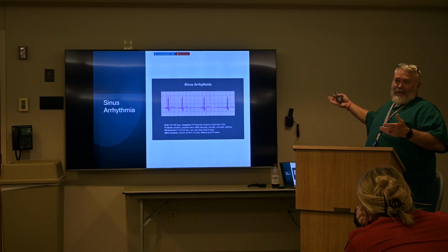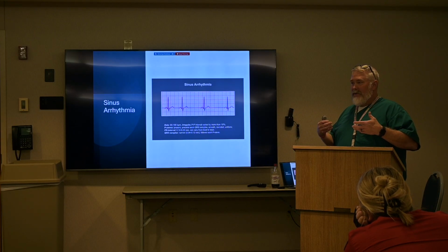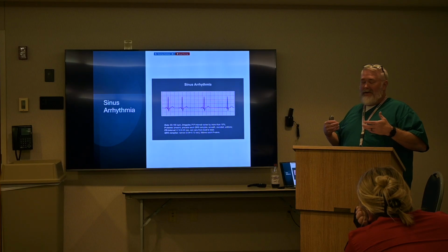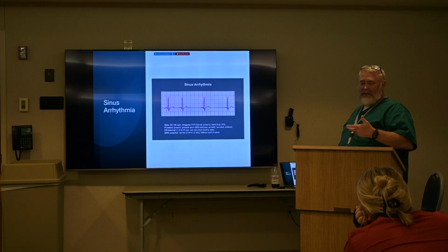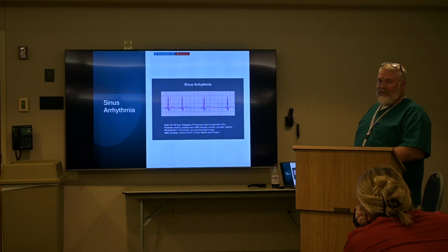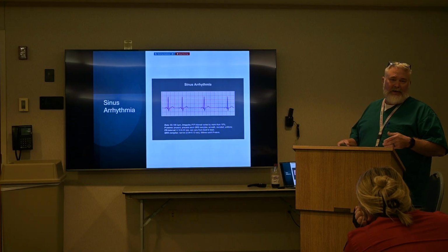This is just a variability based on breathing, and we see this a lot in kids, teenagers, kids that are growing. We see a lot of sinus arrhythmia. We occasionally will see a sinus arrhythmia in adults, but not so much. Typically it's kids that you'll see it in.